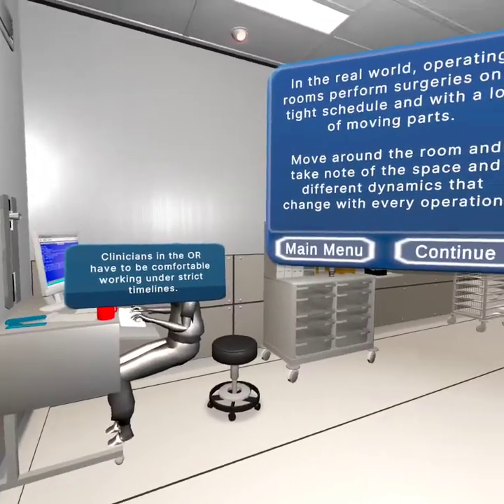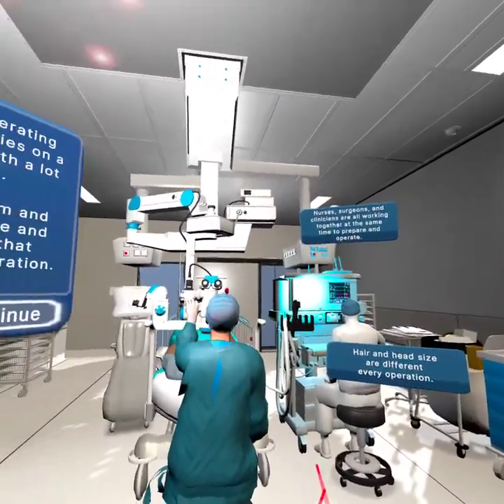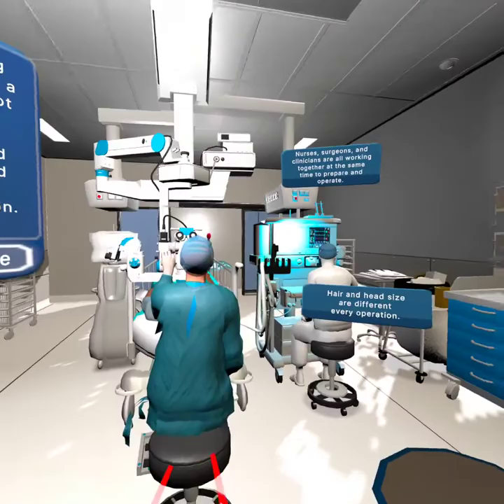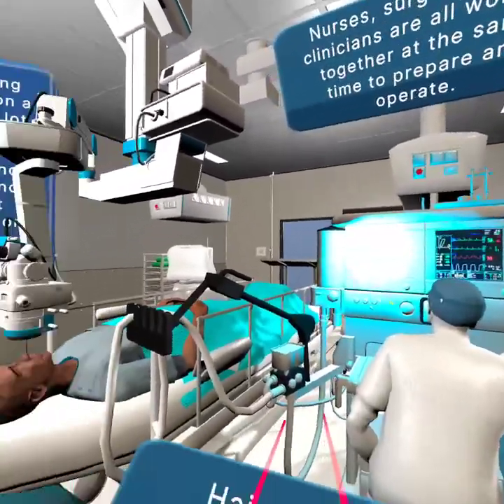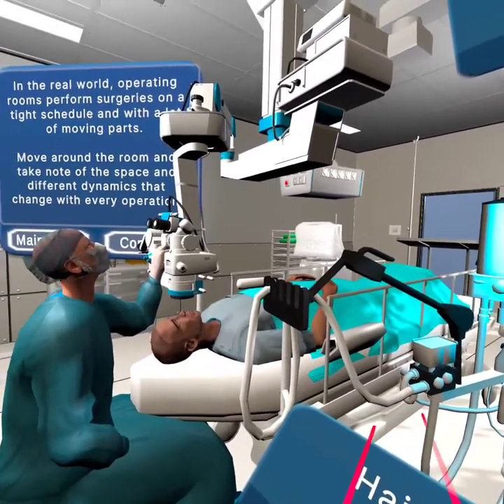The final room of learning mode shows the intraoperative dynamics that a clinician goes through as they are applying the 1020 system. They see what a simulated operating room looks like, and they get a feel for how much space they really do have during an operation.